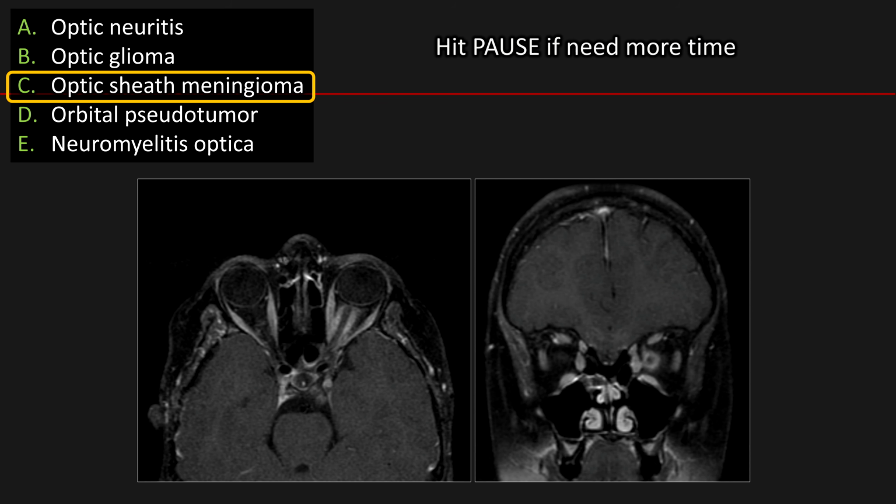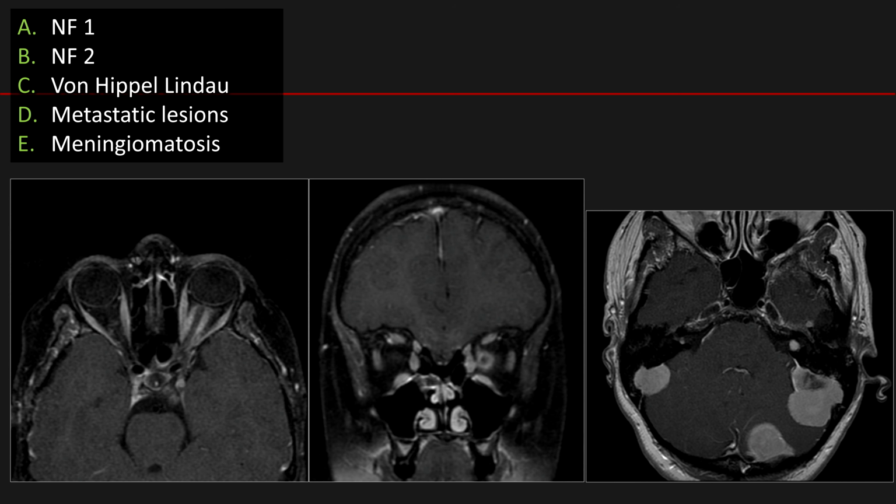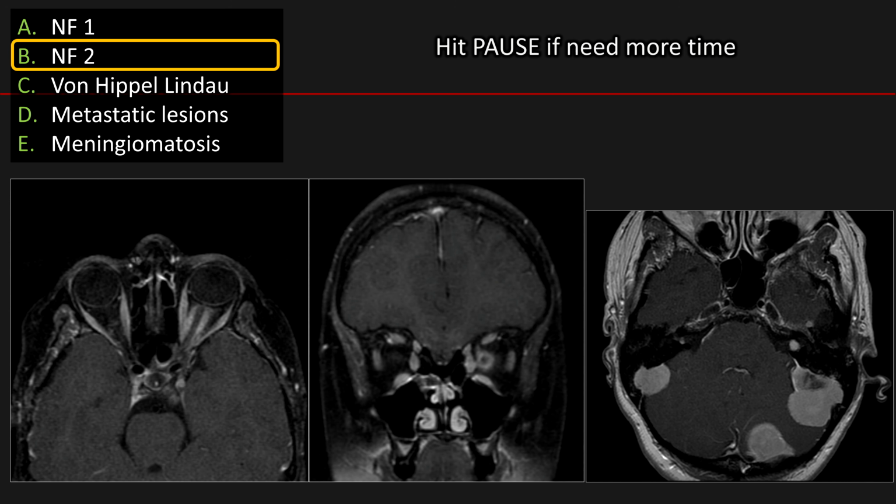Case 9. Meningioma. Same patient with additional finding. With that additional finding, what's your differential diagnosis, or what's your diagnosis? This is NF2. Case 10.